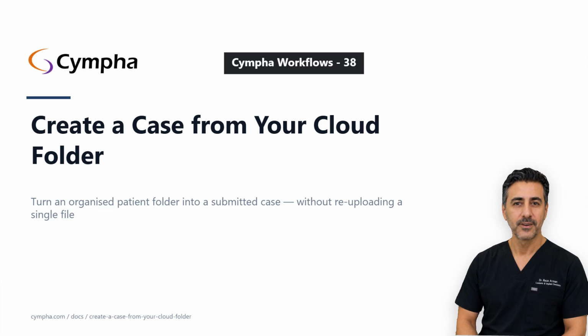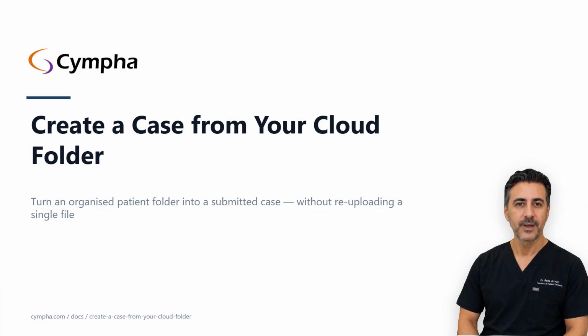cloud. If a patient's files, scans, CBCT, photos, and existing plan are already sitting in a cloud folder, you shouldn't have to upload them a second time just to open a case. This flow starts the case form prefilled from the folder, attaches every file automatically, and leaves you with only the clinical form to fill in.